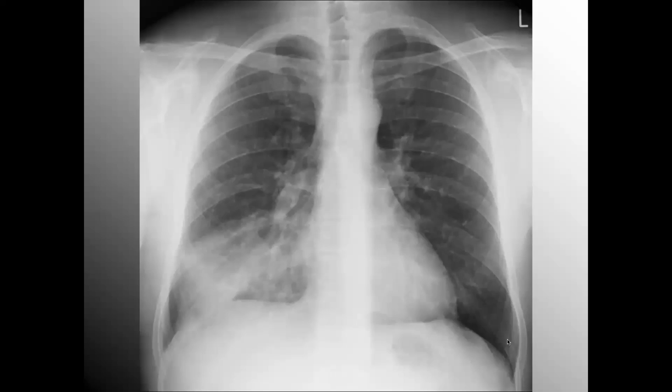So I've got a few more for you here. Hopefully you're not getting too fatigued visually. I know we're looking at a lot of black and white, but I wanted to definitely give you some examples, some of the more common stuff you'll see. So stay with your system. ABCDE: A airway, adenopathy; B bones; C cardiac; D diaphragm; E everything else.